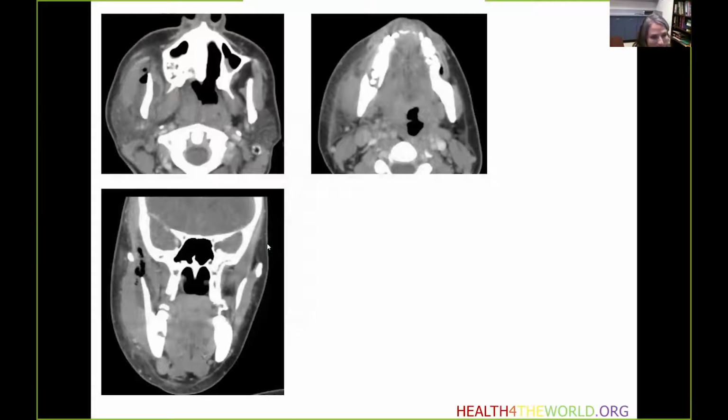Another space, another lesion. Here on this axial contrast enhanced CT, we have the axial CT and the axial a little bit lower down, followed by the coronal plane, through a lesion also within the masticator space, both medially and lateral to the ramus of the mandible. What you can see is that there is this hypoenhancing lesion with areas of gas that is centered in the masticator space, with surrounding soft tissue swelling and fat stranding, but also it extends into the infratemporal fossa.